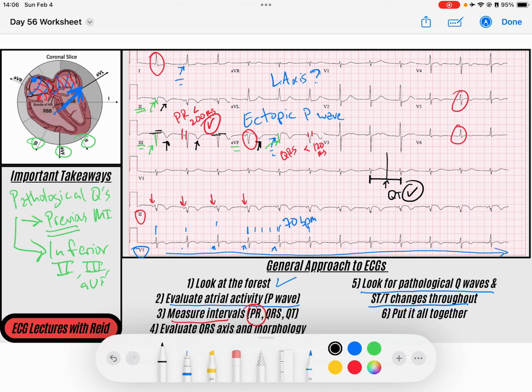What you don't know about this patient is they just had a cardiac cath for an inferior STEMI. So this patient had a STEMI within the last 6 hours. They got a cath to relieve the obstruction, and so now you're seeing the aftermath of somebody who has a myocardial infarction with some of their infarction that damaged enough of the myocardium so that it couldn't conduct in that direction. And so this person just had that occur. So kind of a fun little clinical correlation there.